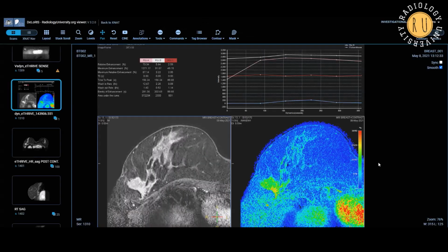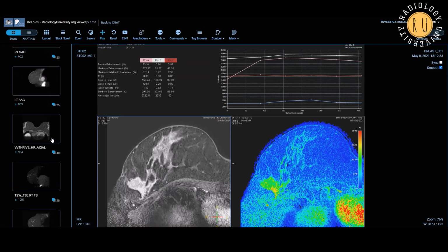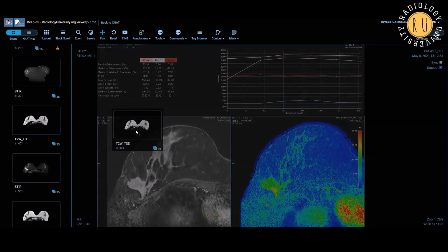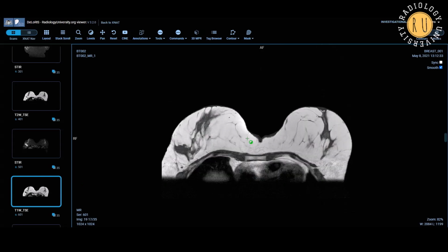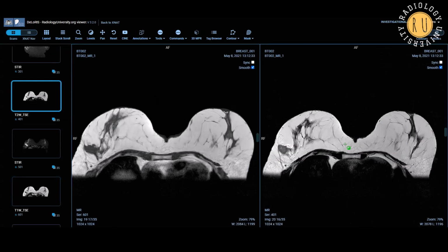It was very nicely described, with succinct points. In the breast case, you can ask which kind of sequence it is, because see, this is T2, this is T1, and this is T2. So you see, it's very difficult to comment, it's very similar. They are very similar looking because of the fat around.